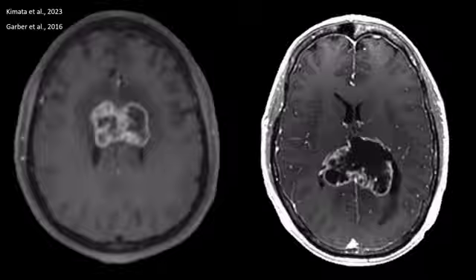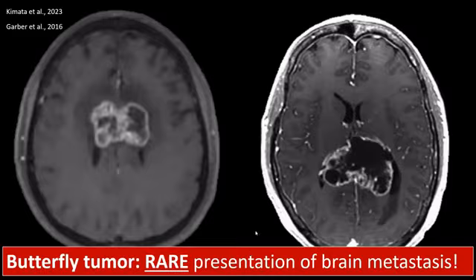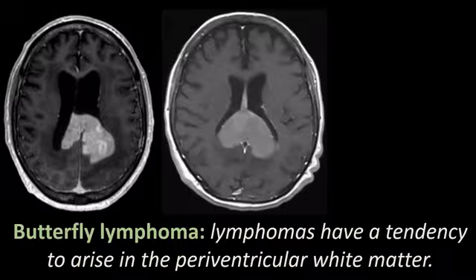So I looked up some case reports on metastases that have a butterfly tumor appearance, and I didn't find many. So these are just two examples, while when it comes to glioblastomas, this is a not infrequent pattern. So a more important differential diagnosis for a butterfly tumor is not metastases, but lymphomas. Lymphomas are less frequent than glioblastomas, but also have a predilection for the periventricular white matter, so they also often arise in the white matter of the corpus callosum and can then spread into both cerebral hemispheres.